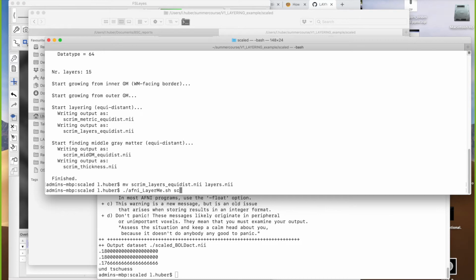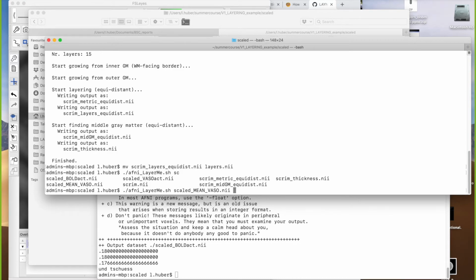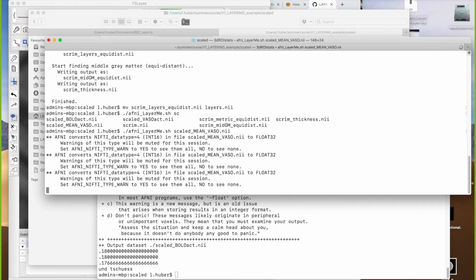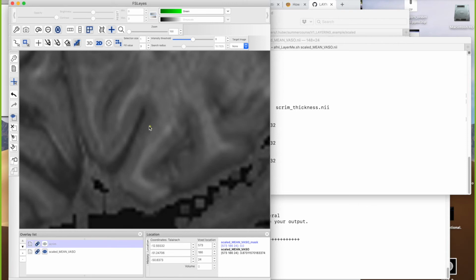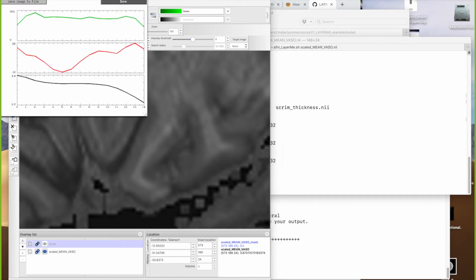The scaled. Let's start with the T1. So this is the T1. The number of layers are now much more flat, as you can see. The standard deviation has this dip here, which is usually kind of a dip in the L shape. It's usually closer to white matter than to CSF in humans, and in rats it's the other way around. As you see, in T1-weighted images the surface is darker. That's why the mean value goes down towards the surface.